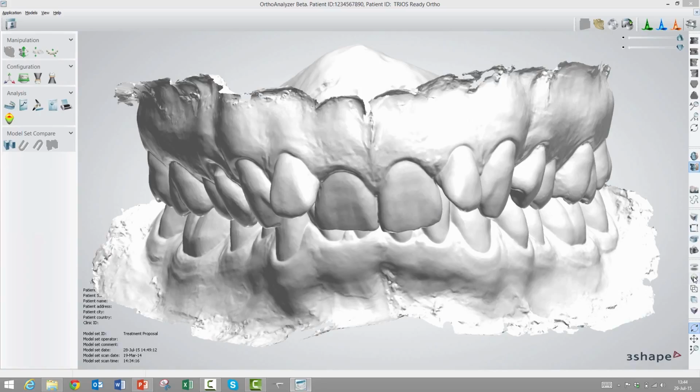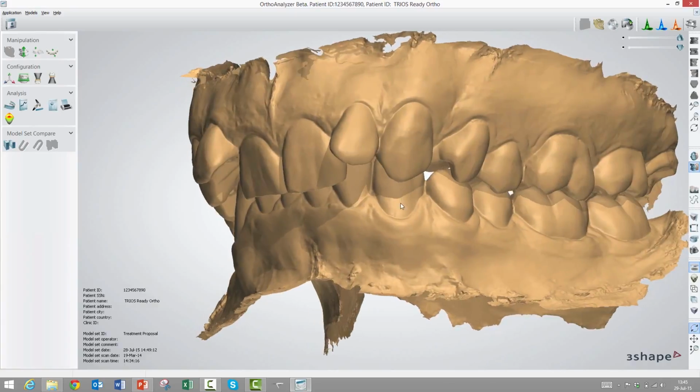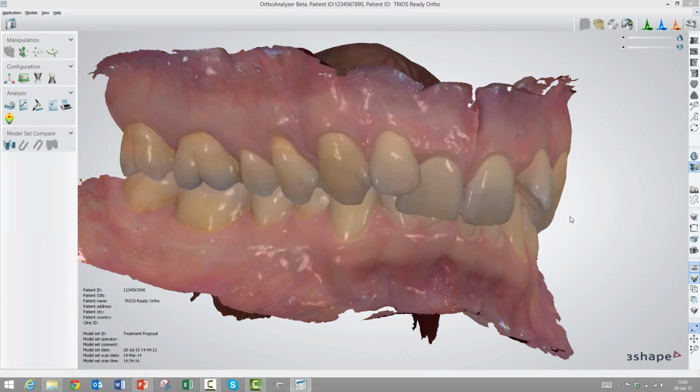When I'm in this mode, the first icon that I skipped actually becomes useful, because this is a very, very flat, almost black and white picture. When I click the first one, you can sort of mimic some shadows and make it look a little nicer. I recommend that you use this tool primarily when you are working in a texture mode, like I have down here, because this gives you very nice shadow and lighting, so it's a little bit easier to look at. That's basically what these two icons do. But for now, I'll just go back to the nice Trias colors.